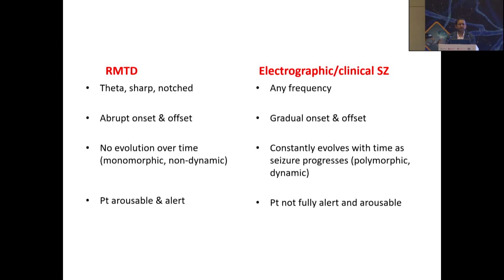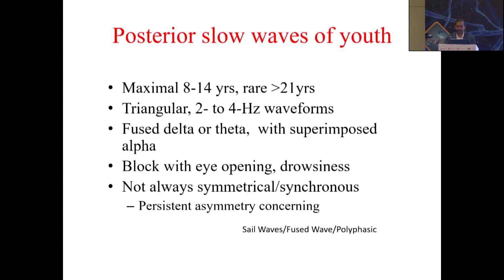So the differentiator from seizure is that it will be sharply contoured, with abrupt onset without any evolution.